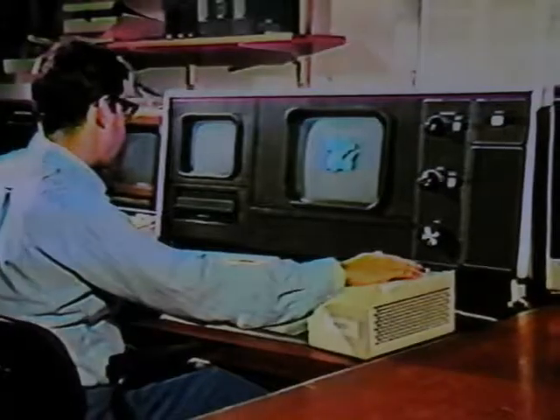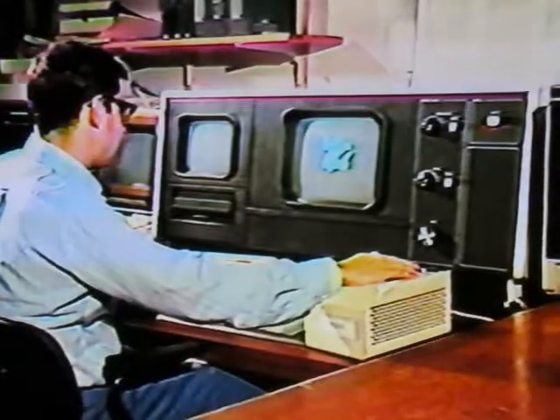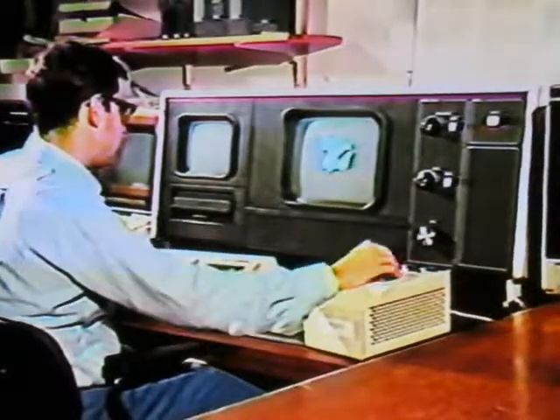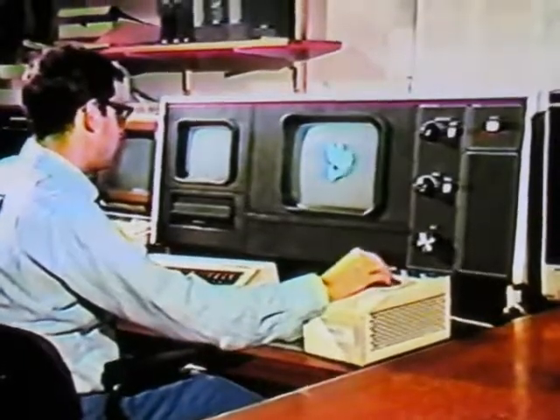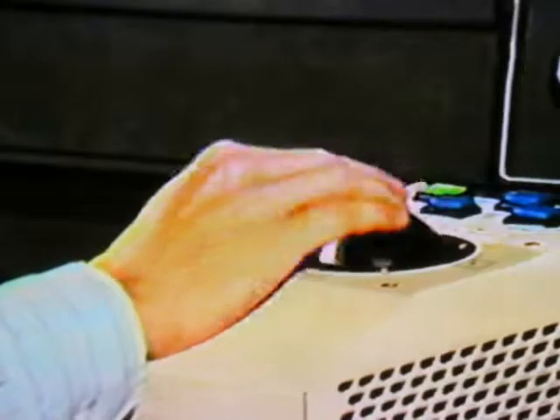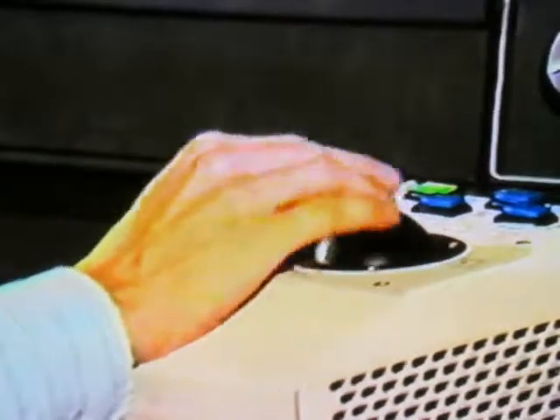We have built an interactive physician's workstation prototype using a special-purpose graphics processor designed and built in the GRASP lab called the Voxel processor prototype. Workstations of this type have applications in clinical diagnosis, surgical planning, radiation therapy planning, and other clinical areas. The Voxel processor prototype allows the real-time display and manipulation of medical images.